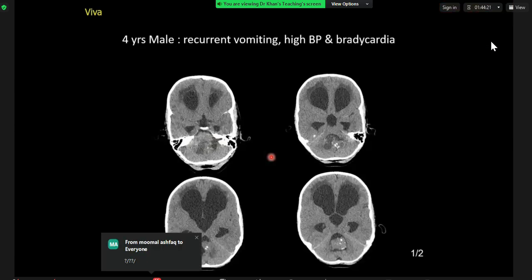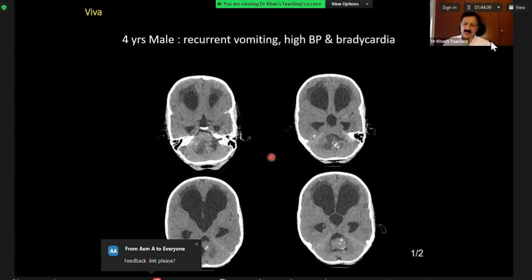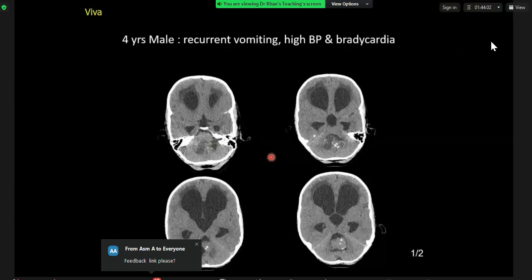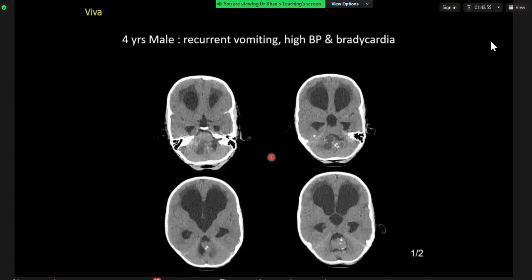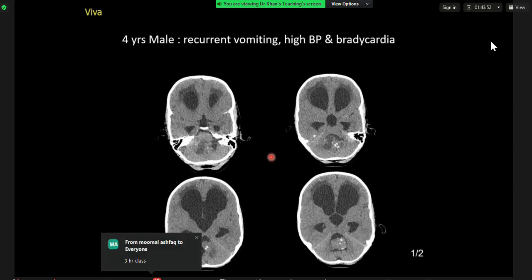So is there synchronous tumours of the fourth ventricle and the IAM, or is it mass effect from a, so is it a phacomatosis? No. You see, please, this has to be from the differential diagnosis which we just considered, just spoken about. So pick up your choice from there. Well, the cerebellar astrocytoma, because it has calcification, potentially not epicenter within the ventricle, as it were, but it's extending into it.